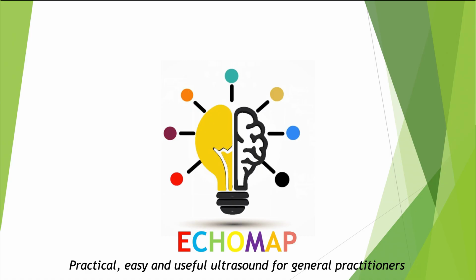So today we're going to go back to basics a little bit with a clinical case that made me think of beginners. And we're going to talk about cysts. In this video, I'm going to give you the 3 essential criteria that make an image a cyst. That is to say, they'll allow you to confidently diagnose a cyst without falling into the trap, without tripping up. Because very often what I hear my residents say is completely wrong, since most of the time people say that a cyst is anechoic and black. But actually, that's not the definition of a cyst. You can have different cystic images, and that's the case today.